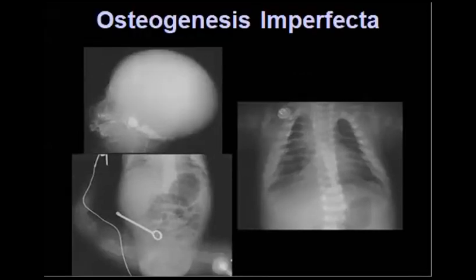Okay, what else? Irregularity and bowing of the bones. Yes. Variable fractures with multiple ages as well. Yes. And as you mentioned, also the skull shape can be bell-shaped skull, bell-shaped chest. Maybe all this gives you the impression that it will be osteogenesis imperfecta. Yes, Alaa, there is a left inguinal hernia as well. Yes.